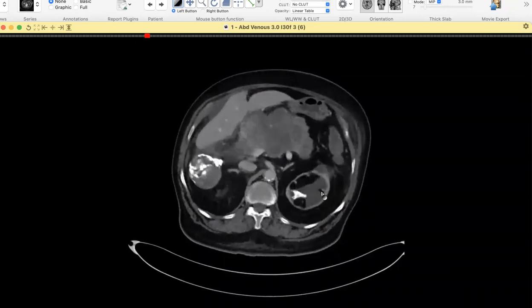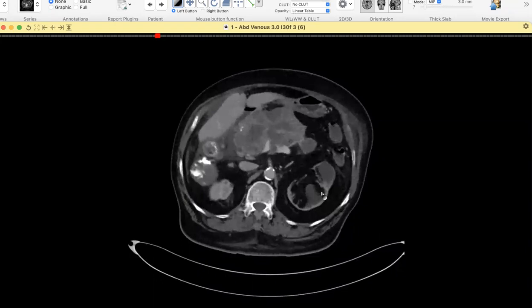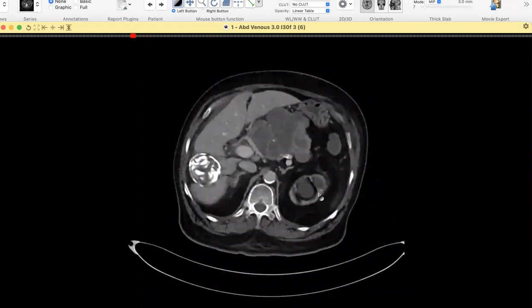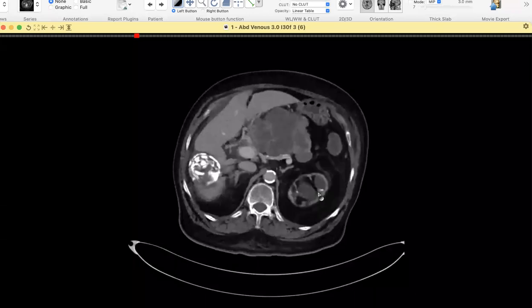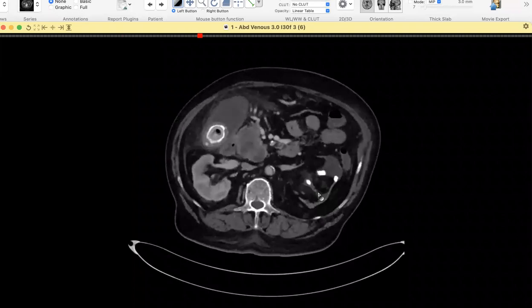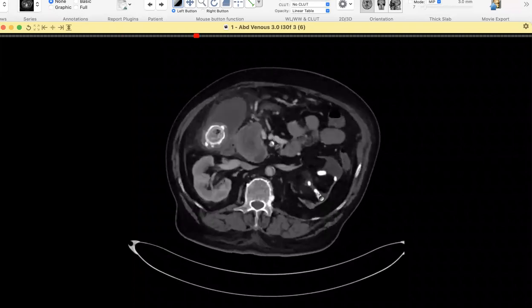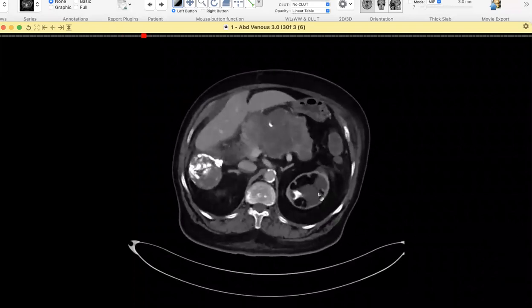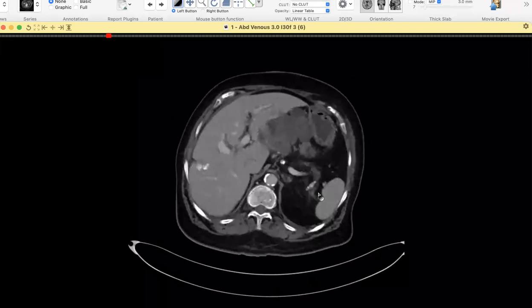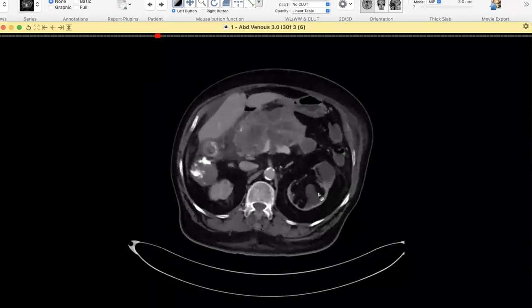For the pancreas, it could be pancreatitis, autoimmune pancreatitis, because it is very hugely big. And it is old age, so this could be mucinous cystadenomas in the pancreas, because they are big cysts, not small.